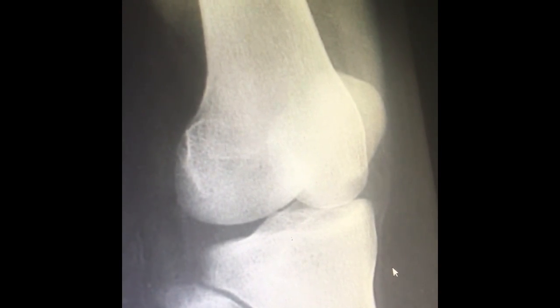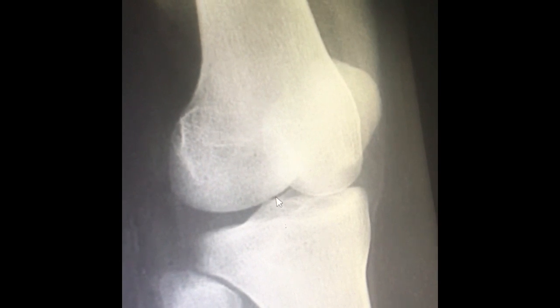separated at their proximal articulation, which is right here. And then we're looking out for the posterior tibia, and then lateral condyles of the femur and tibia, and making sure we have both tibial plateaus, and making sure the margin of the patella is projecting slightly beyond the medial side of the femoral condyle. So make sure that patella is pointing medially, and looking for an open knee joint once again. And then just making sure we have soft tissue and bony trabecular detail.